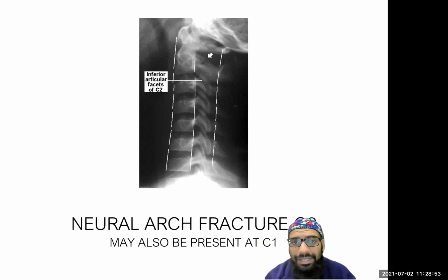The other thing you've got to take note of in the C-spine is that normally the C-spine is curved. Even when we're looking at this one, you can see this one is absolutely straight. So when you have an absolutely straight C-spine, you've got to start thinking of muscular spasm. Now, this can occur purely in muscular spasm, or it can occur, for example, when there is a fracture. In this particular set of x-rays, I'm not too worried about you being able to figure out the diagnosis. We're going to see the diagnosis, and we're going to look at the x-ray and analyze each one at the same time so that you get an idea of what your C-spine should look like.